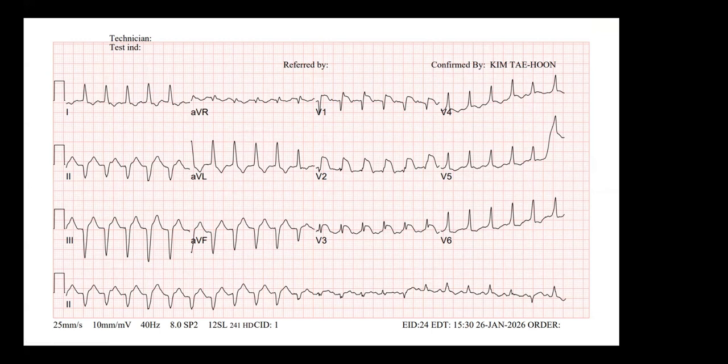However, in lead 2, the bottom rhythm strip, take a look at it. There's an impression of intermittent QRS width variation. I think that's still not purely VT, probably some degree of fusion going on. You can further prove that: when the wide complex starts becoming narrowish looking, there's a different degree of fusion going on until that negative QRS complex.